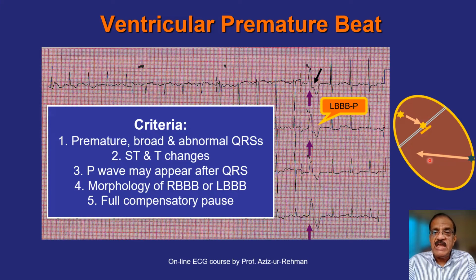Note this would depolarize the ventricle, but there is a block. This is the normal block: the AV node would only allow current to pass this way in normal circumstances. So this depolarization will not be able to enter the atria. That explains that for the atria nothing happened, like something happened in your neighborhood and you never got to know. So this ventricle will be depolarized, and for the atria, atrial activity occurred and created a beat, but it could only depolarize the atria, which appeared as a small notch after the QRS complex. It could not go to the ventricle. It could enter, but it found the ventricle in a state of refractoriness because of this ectopic. So the ventricle would not respond and would not produce a QRS arising from the P wave of sinus origin.